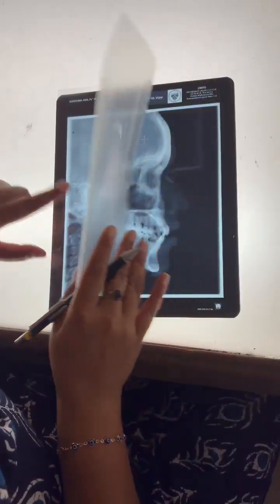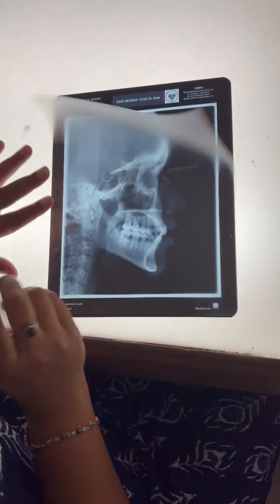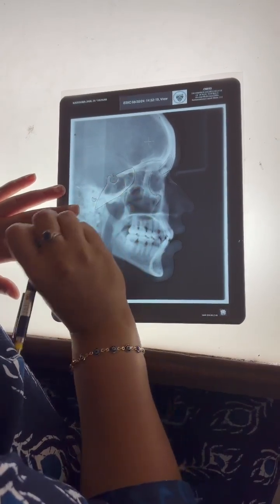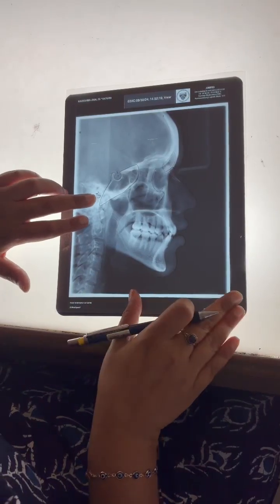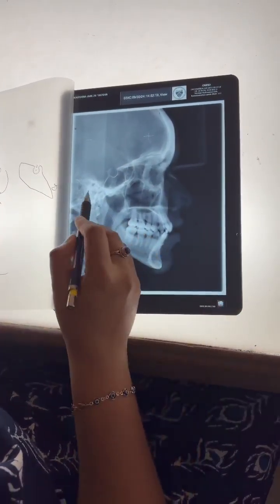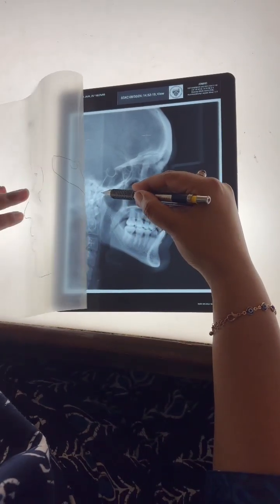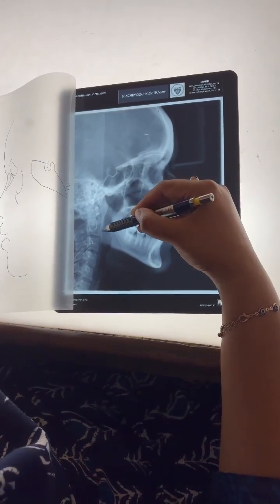Okay, then we have our porion, which is supposed to be kidney bean shaped. Very nice. Or crescent moon shape. So your porion. The upper part becomes your P. If at all it is inverted, it can be straight, it can be slanting, it could be depending on individual. The upper part. Okay. Then can you see this? What is this? Condyle.